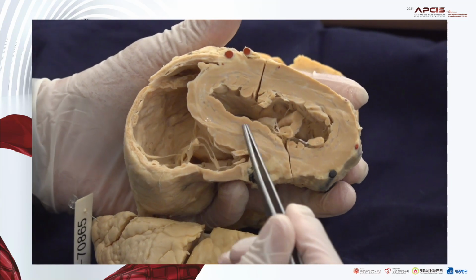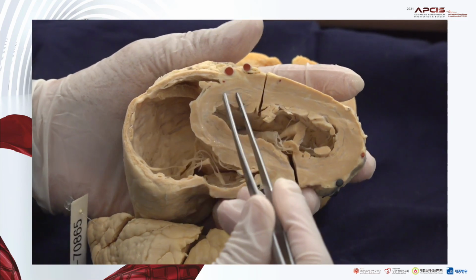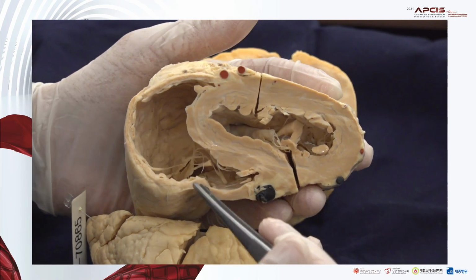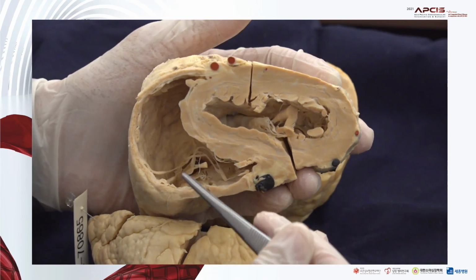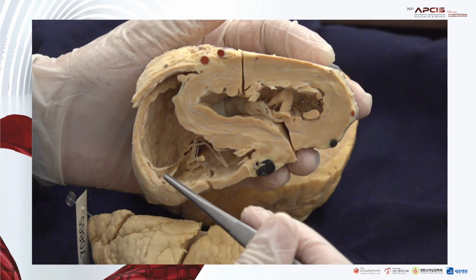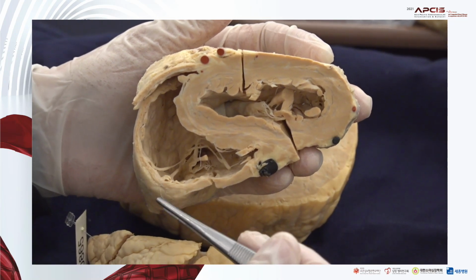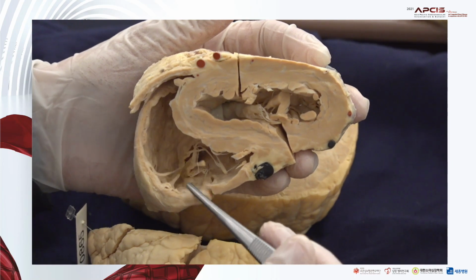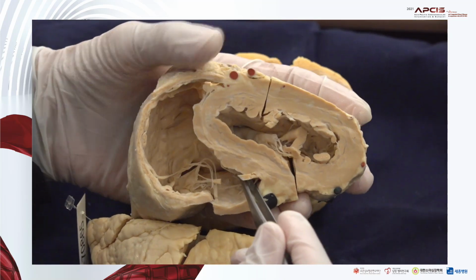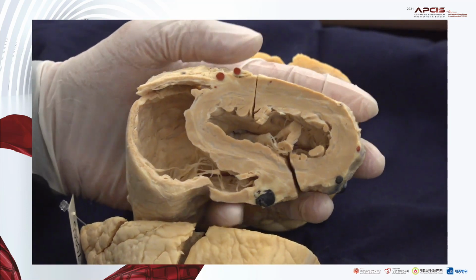As you can recognize, the macroscopic distribution of scar is a characteristic feature. Also, involvement of sarcoidosis in the right ventricular wall makes right ventricular thinning and replacement with fatty tissue. So in some sense, if you look closely at this area, we may say this can be a kind of arrhythmogenic right ventricular cardiomyopathy. But in this case, I think it's not. There is fatty replacement, but it is predominantly a fibrotic lesion. So I'd prefer this as sarcoidosis, in addition to the previous biopsy with granuloma in the endomyocardial biopsy. So let's return the microphone to Professor Park.